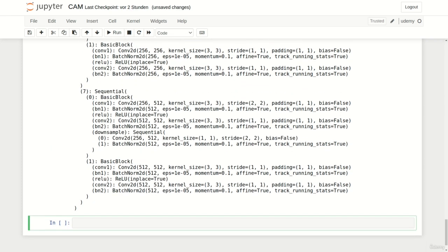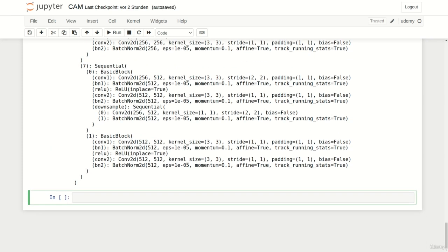Now we are ready to implement our adapted pneumonia model. We simply add an additional output to the forward function, which returns the feature map of the last convolutional layer. Note that as we threw away the adaptive global average pooling and fully connected layer, we need to manually add them back to the network.